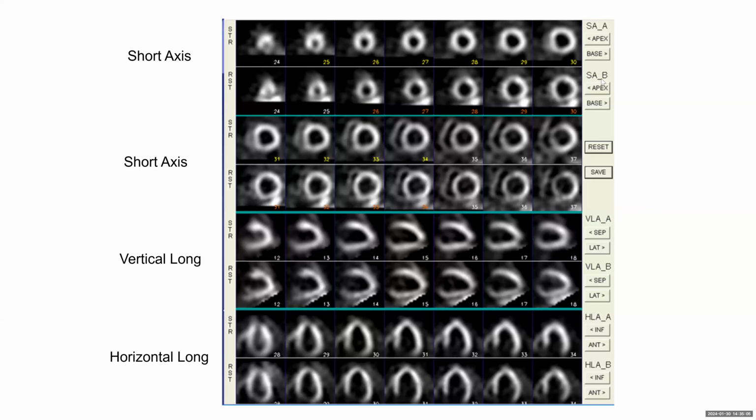Yeah, so looking at this, the nuclear perfusion scan, you don't really see a clear perfusion defect as you mentioned, but what do you really see in this? What's remarkable about it? Two things you mentioned. The first is the LV dilatation, and the second is there is some RV uptake. So how would you classify, or what would you answer in the reporting?